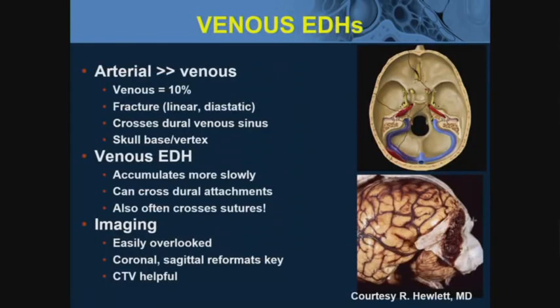And we'll see that if this one crosses the site of dural attachment and a venous channel, here's a skull base fracture through the squamous part of the occipital bone, it can tear the venous sinus and produce a venous epidural. Here is an autopsy case underneath.